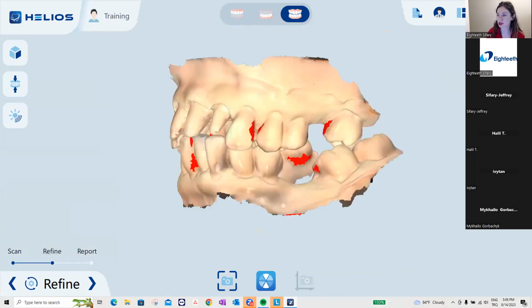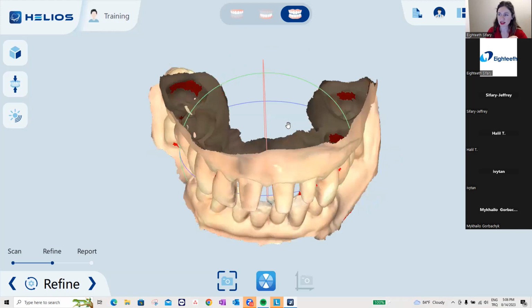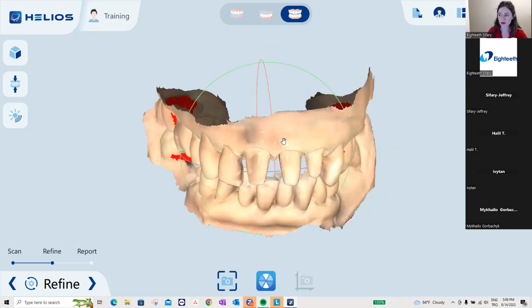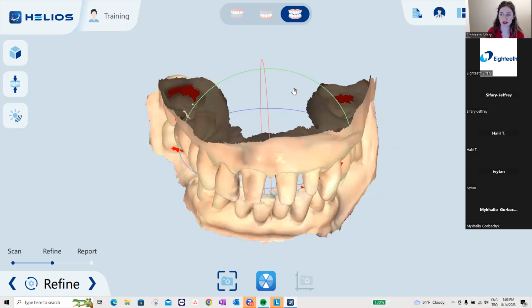And while observing, if you'd like some guidelines, if you click this 3D, you are seeing some circles around it. Sometimes it will be easier for us to understand as a reference point.